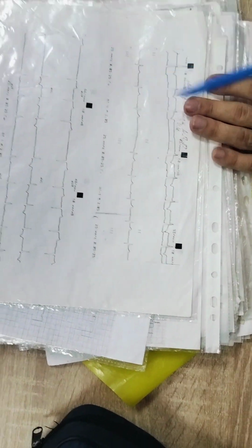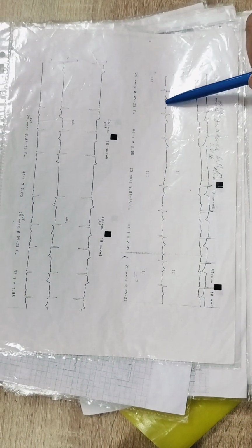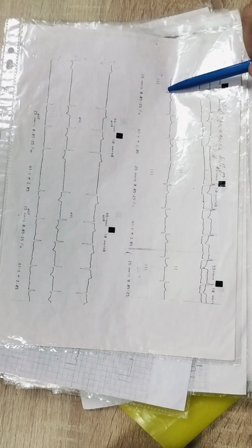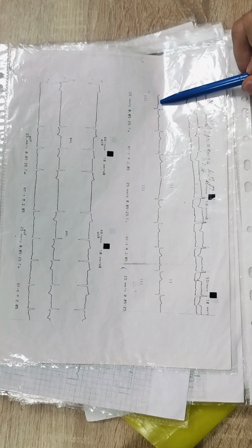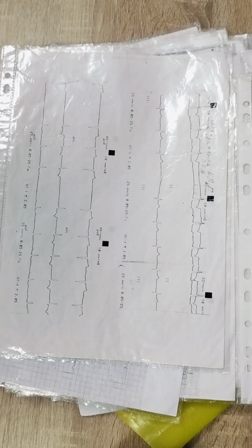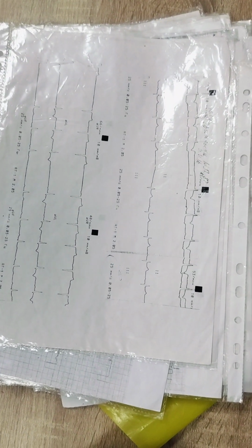About this Q wave. This Q wave is alone, without ST segment changes and T wave elevation or negative T wave. Patient had myocardial infarction previously. This Q wave is marker of previous myocardial infarction. Third lead, it's not acute, because there is only Q wave changes. In acute stage, there is elevation of ST.